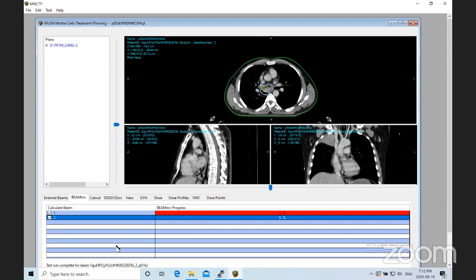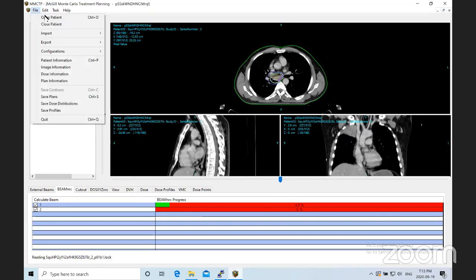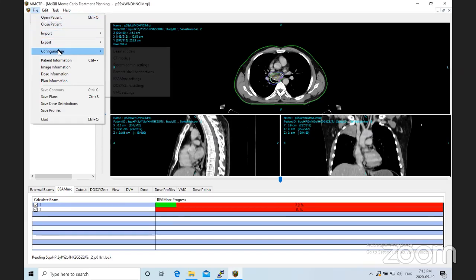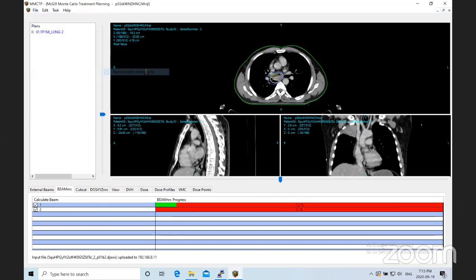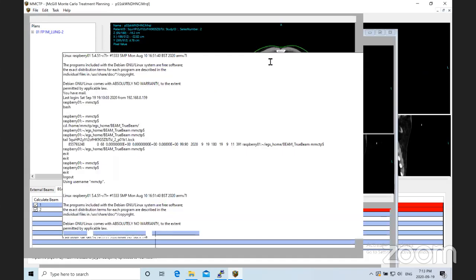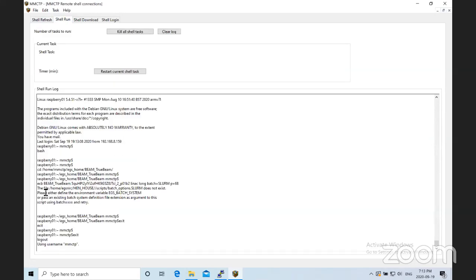Okay, so now let's see if I'm going to have the same problem. Yeah, you will have the same problem. I can show you where in the code the changes should be made. I changed it, and it works on the Mac version. Okay. And I compiled it, but let's see now. I want to see if it works with the Windows version. Okay, still having the same problem. Yeah, so it's the same, but for the Mac version, it works.